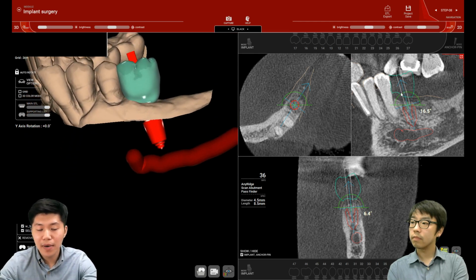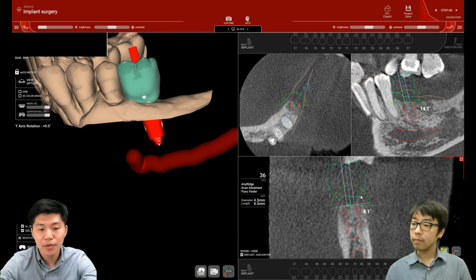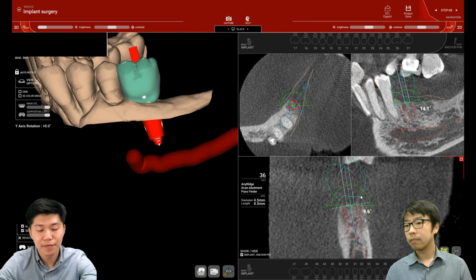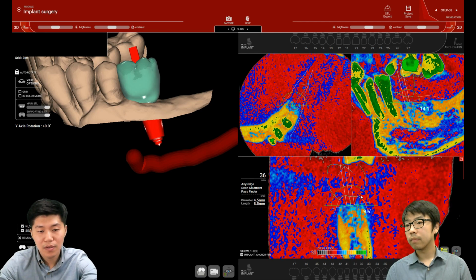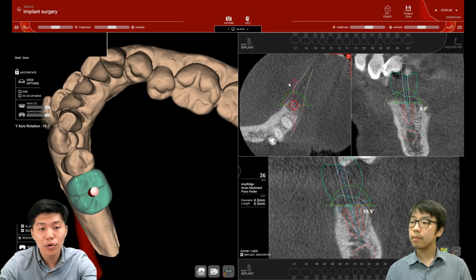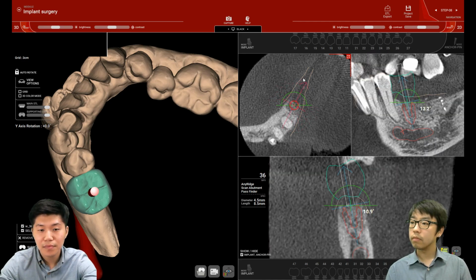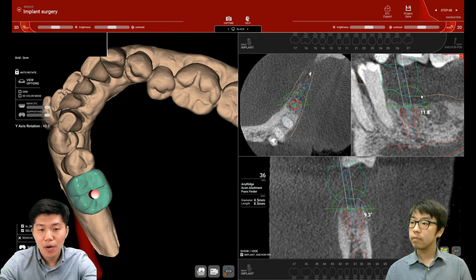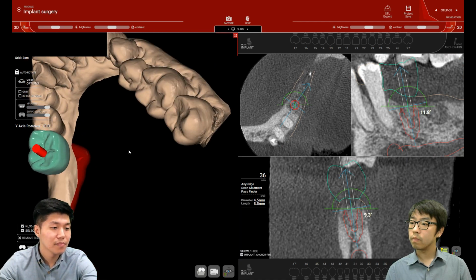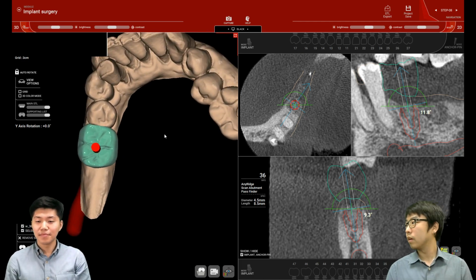And now I'm going to use my shortcut keys to move my implant around much more accurately. And also use my digital eye for different filters to see, as well as this arrow to go around 180 degrees to see all these different slices. Once I have done that, it is done. Sounds simple enough.